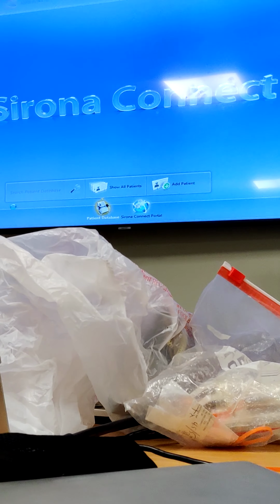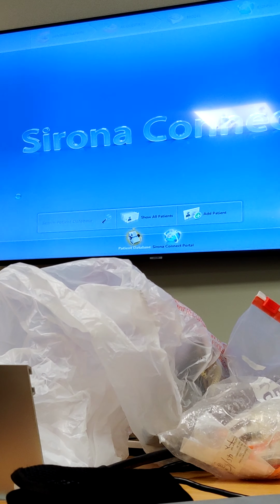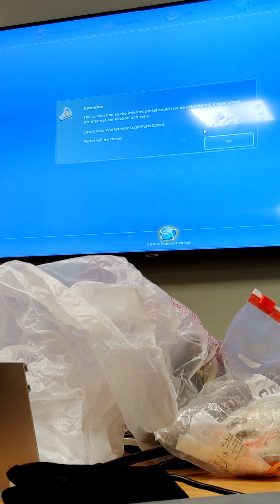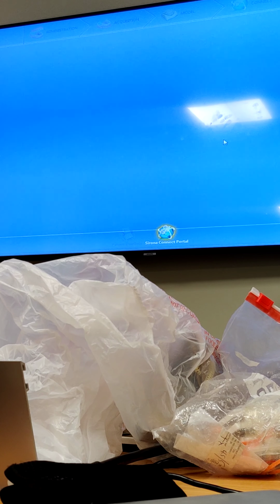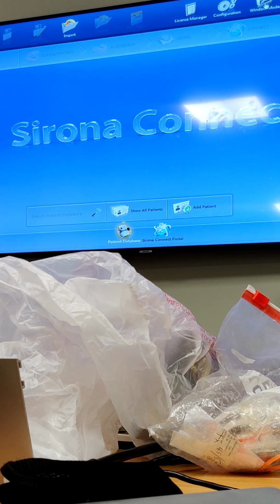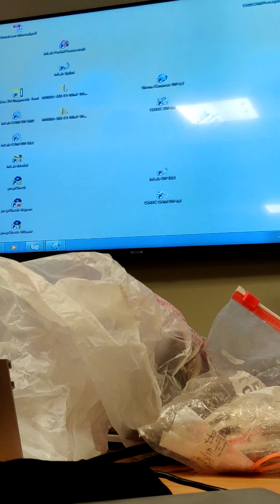Now again, I don't know if they've set up Atlantis as a web, as a lab. I don't believe that is set up. No. We'd have to maybe set that up during lunch. Okay, let's see if I'm still connected to the internet. No internet access.